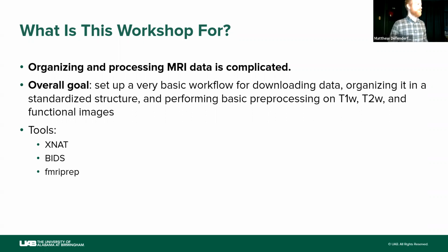Xnat is available to anybody at UAB that is scanning on the Prisma. It is essentially an online repository for all of the scans that you do at the Prisma, as long as you push it up to Xnat. It's very easy to use, so it actually saves a lot of time getting scans off of the scanner after collecting them.